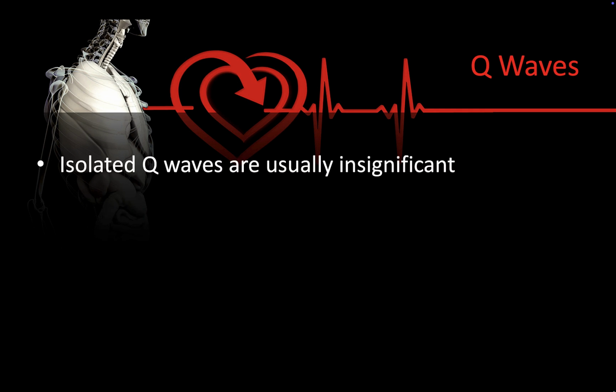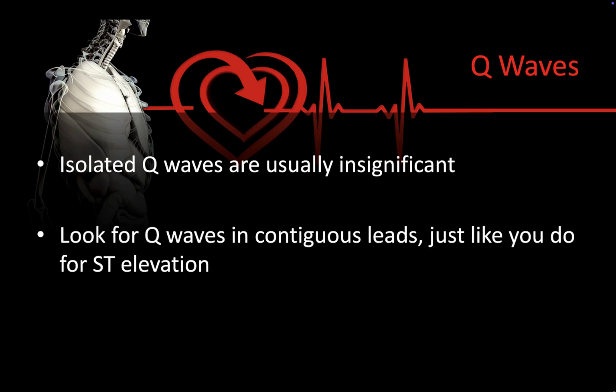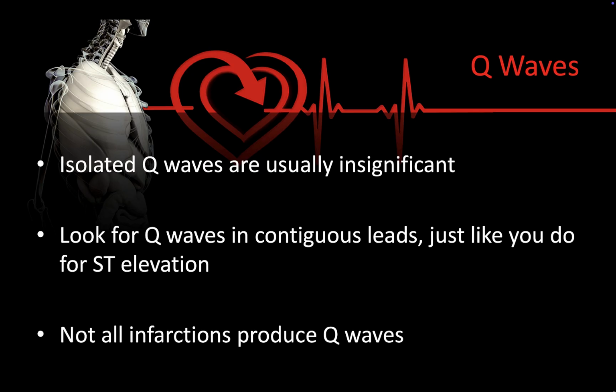Isolated Q waves are usually insignificant. In other words, if you see one or even more than one, but they're not contiguous, it may be a random electrical event and it is not considered diagnostic. We look for Q waves in contiguous leads, as I just said, and we should also recognize that not all infarctions will produce Q waves.